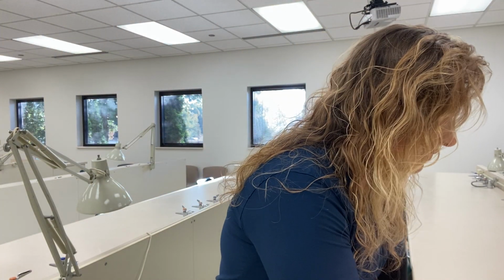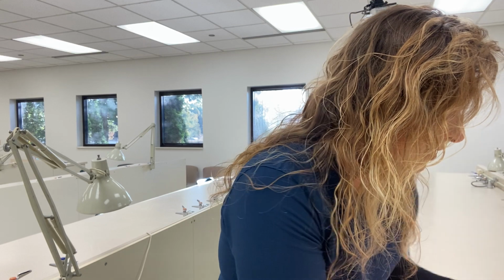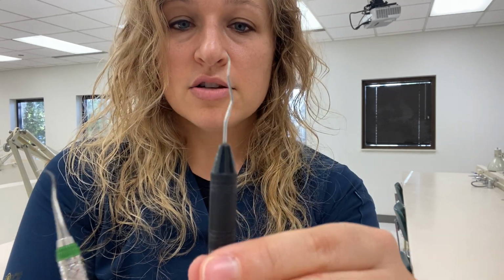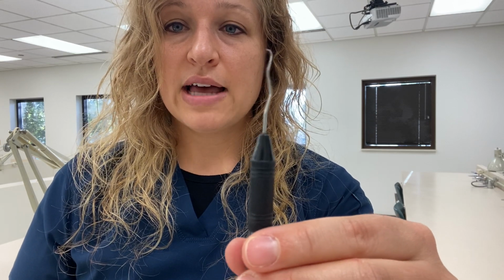As far as shank flexibility, let me show you the difference here. We've got a shank with our assessment instruments, our Explorer, that is very thin. By looking at this, you would not think that you would be using a lot of lateral pressure because it is so thin. You're not going to be pressing hard. It's not going to do anything. Whereas with this one, you've got a thick shank.